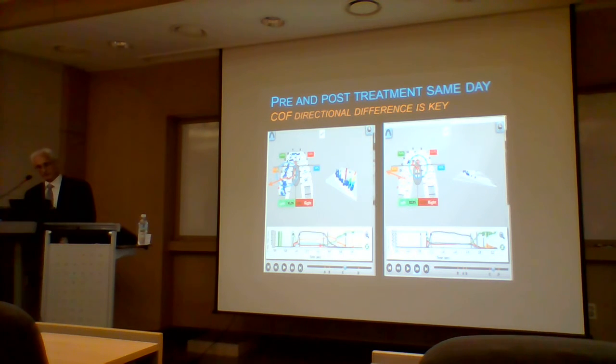And in the graph, the orange quadrant is in control of the excursion for a long period of time, essentially from 3.3 seconds until 4.9 seconds. So 1.6 seconds.